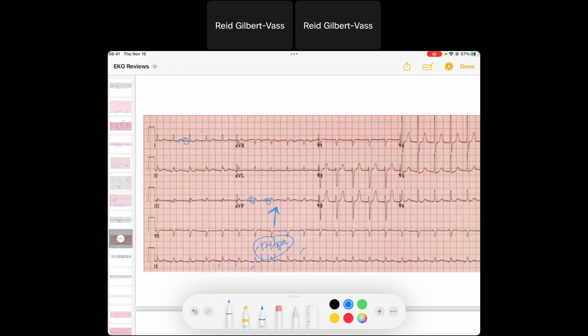So if I drew my atria right here, and my sinus node is usually just like so, and my sinus node depolarizes down and to the left, there's probably an ectopic focus, like somewhere along here, that's spreading signal up and it depolarizes up. And so that's why you're getting that P wave that is down in AVF.